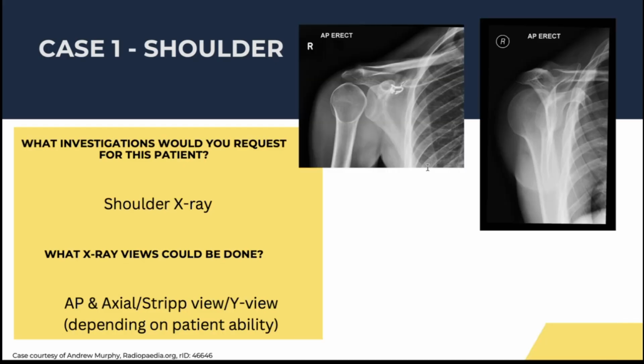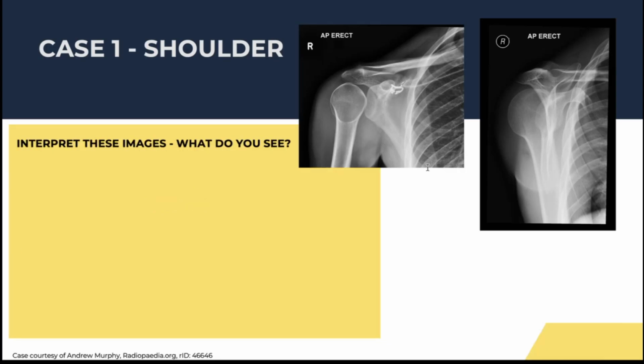So here are the images that we have taken. If I get you to just have a look at these images, what kind of things do you see and what would you suspect from looking at these images?